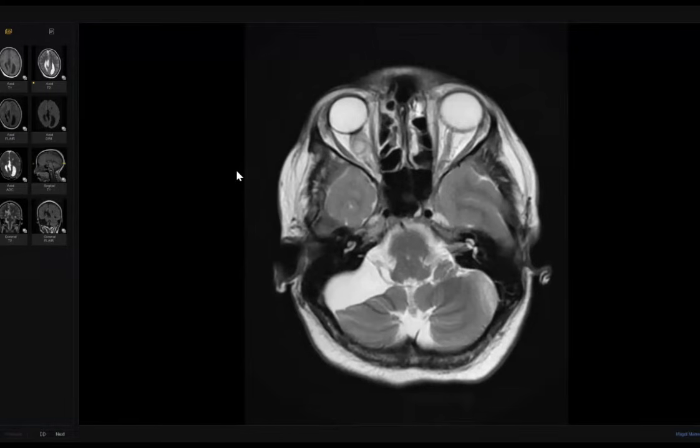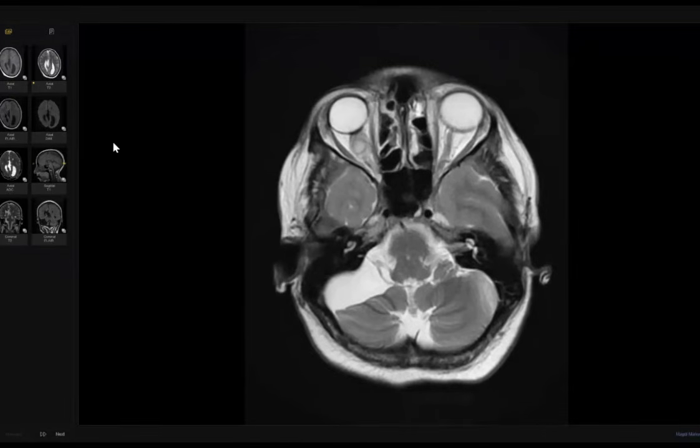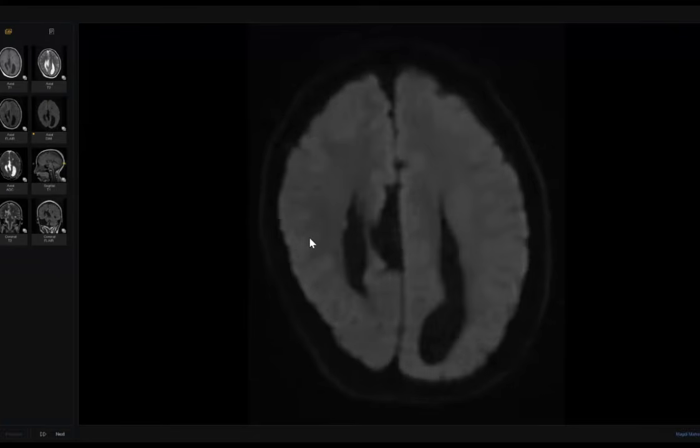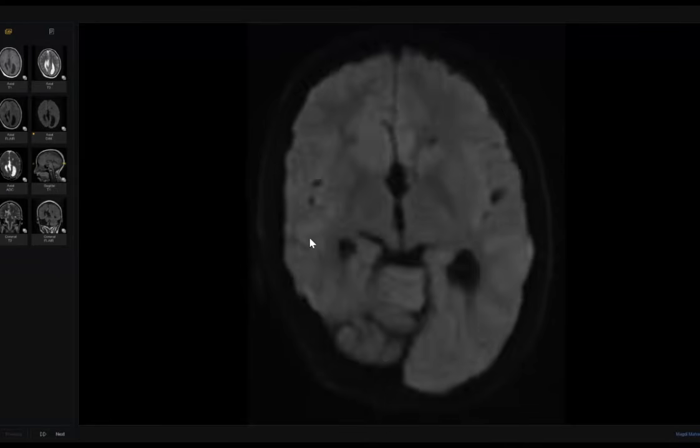No, right. What did you find? Is this glioma or meningioma? Can you scroll for me? Maybe a cyst. Finally, it was a case of multiple congenital anomalies. Correct? Is it clear?